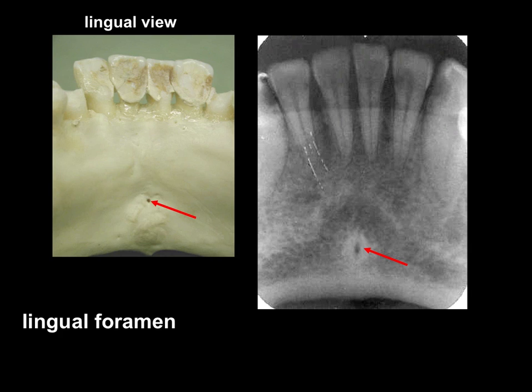Now, that's not terribly important where there are teeth present, but if in a patient who's, for example, edentulous in this region and who may have a little retained root fragment, it helps you to localize where you are on the radiograph in relation to the mouth.